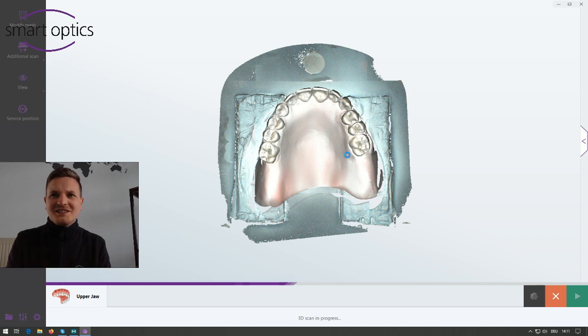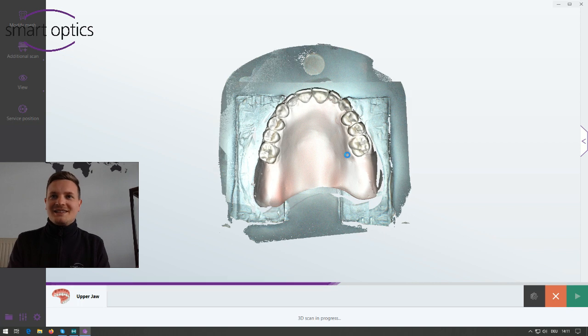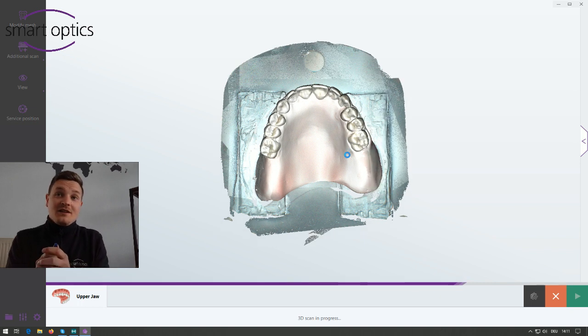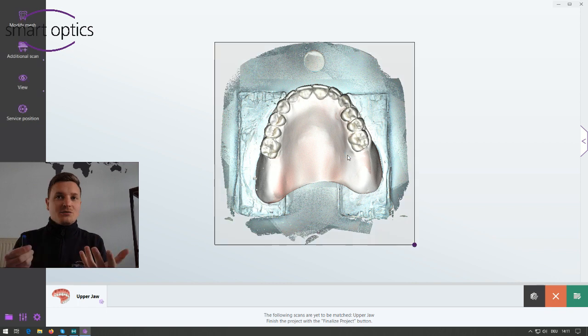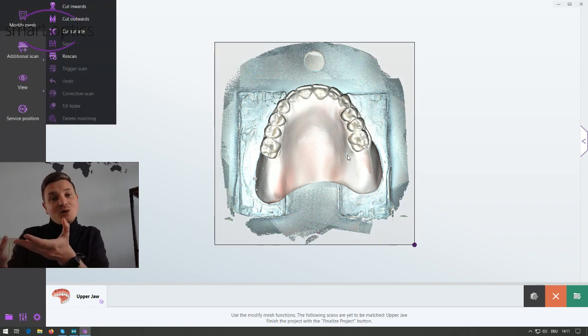I don't know if it is the right word for that. In the dental field, it's the basal area of the prosthesis, of course. And then you can use this prosthesis, for example, as a situation prosthesis for your upcoming work. If you have a client who wants you to do a total prosthesis, you can use the old one and scan it as a wax-up or as a situation.